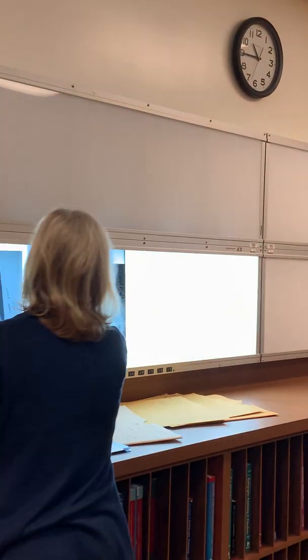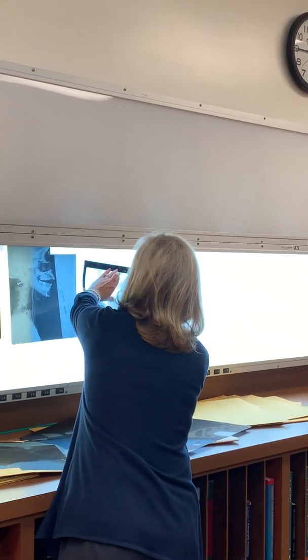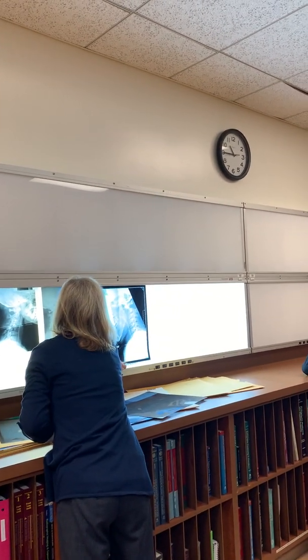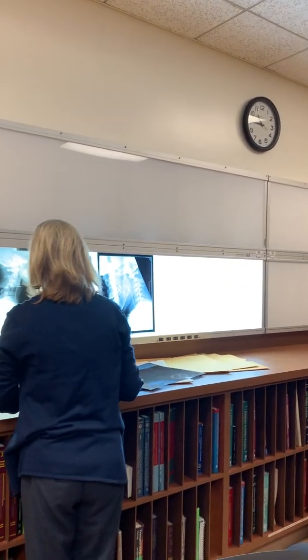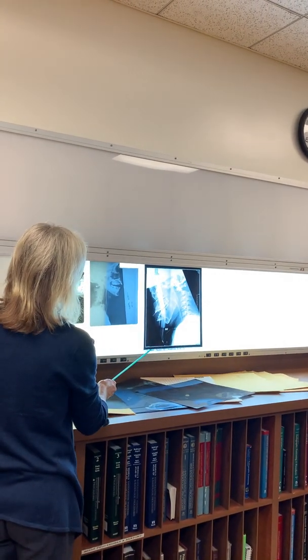I need to cover up this. I'm standing in your way, Shane. Oh, C1, C2, and C3. Wait a minute, the teeth? Oh, I'll show you. It's a hangman's fracture. So, it was a car accident.